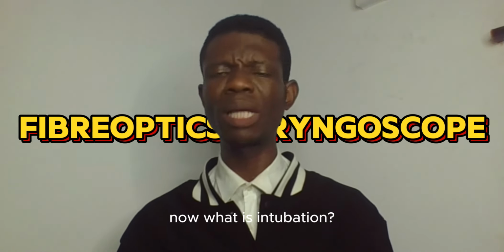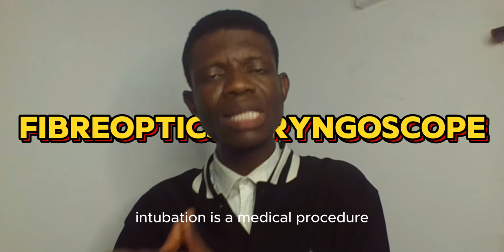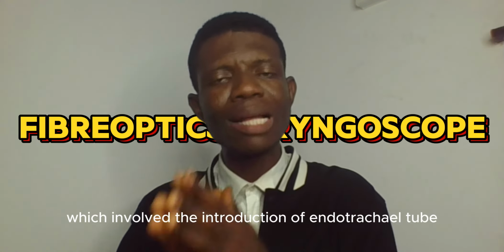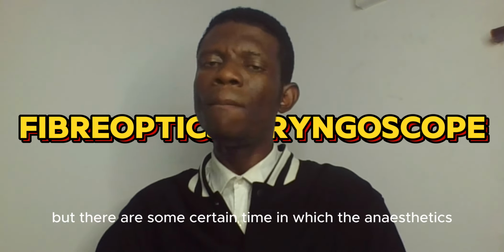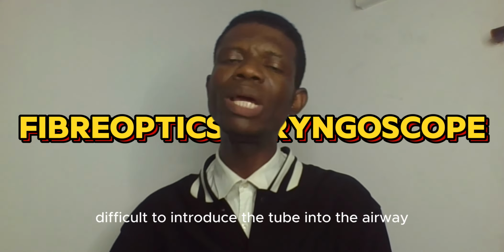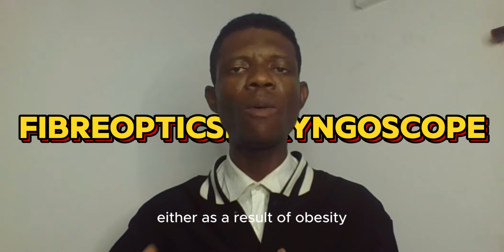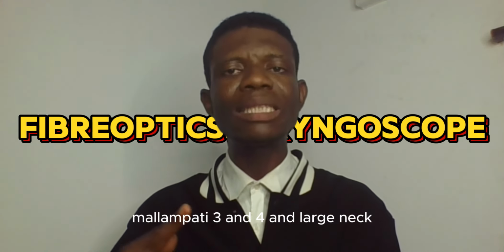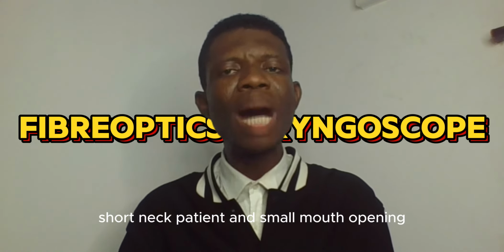Now, what is intubation? Intubation is a medical procedure which involves the introduction of endotracheal tube into the airway or into the trachea. But there are certain times in which the anesthetist finds it difficult to introduce the tube into the airway, either as a result of obesity, Mallampati 3 and 4, large neck circumference, short neck, and small mouth opening.